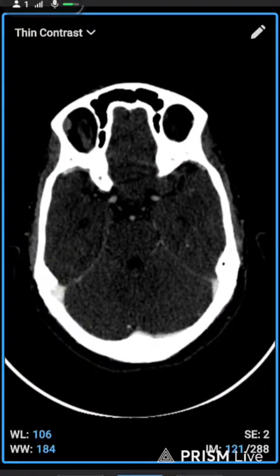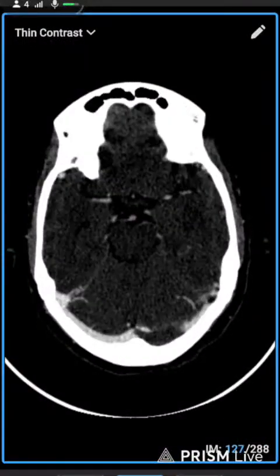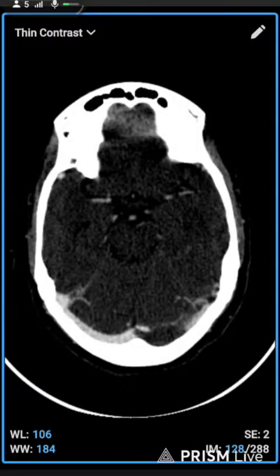Here is the basilar artery. In the brain, everything now divides into multiple arteries. So the middle cerebral artery left, middle cerebral artery right, and this is the basilar artery.